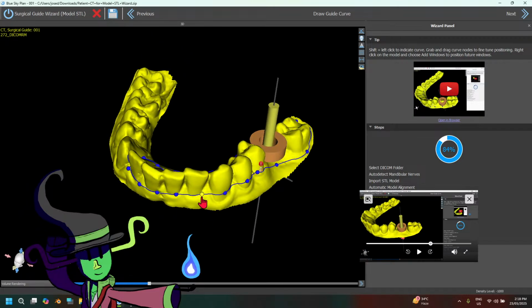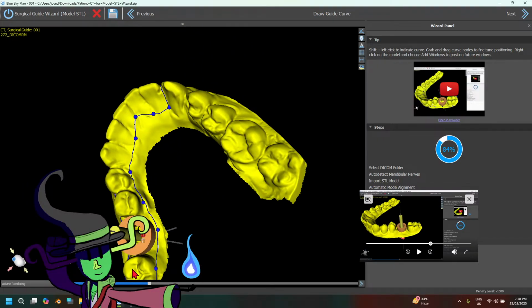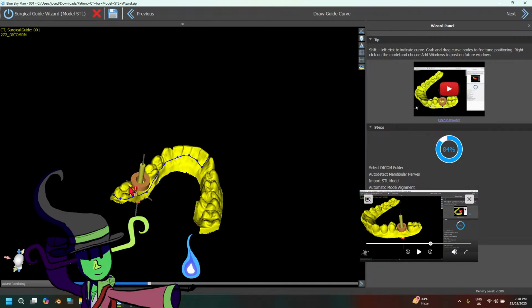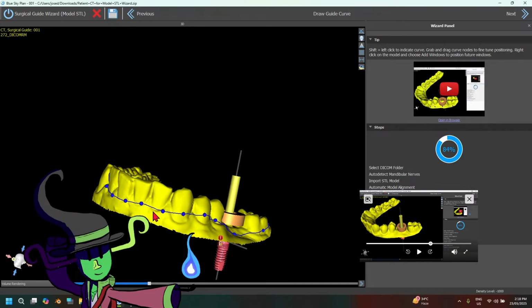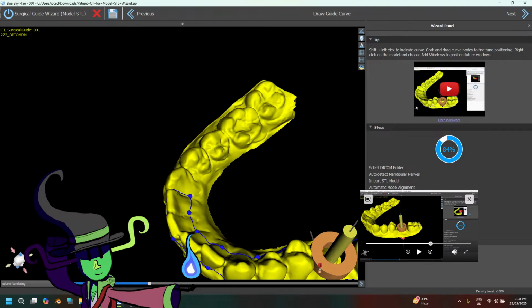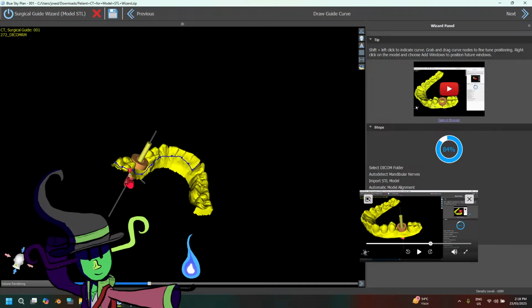Okay, everything here looks good. This back over here. Sweep, sweep, sweep. Okay. All right. Just like this. Okay. Alright.